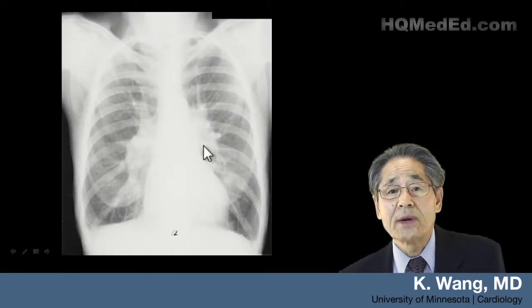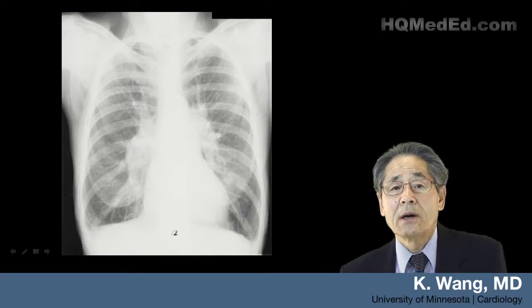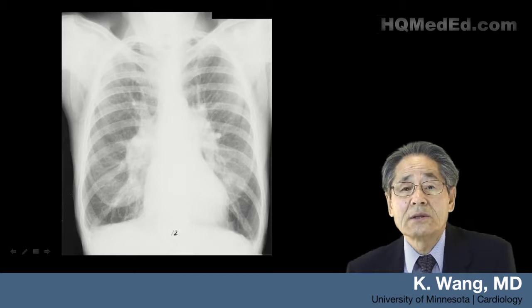This patient too has a markedly enlarged left and right pulmonary artery, including some congestion. This patient may have had congenital heart disease with pulmonary hypertension.